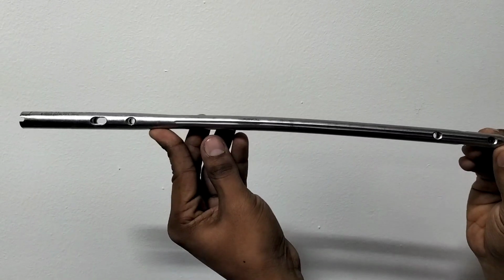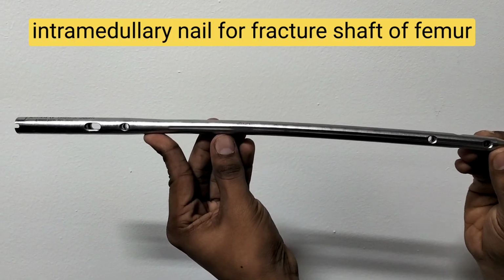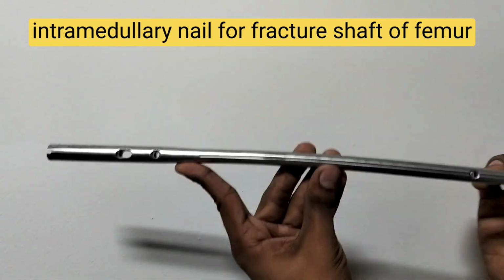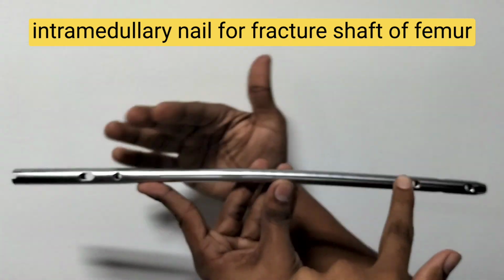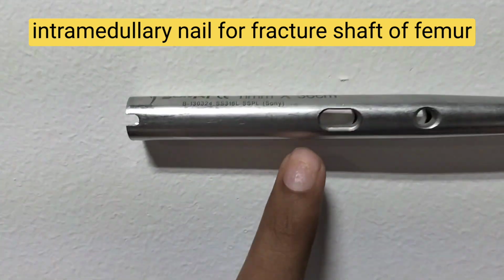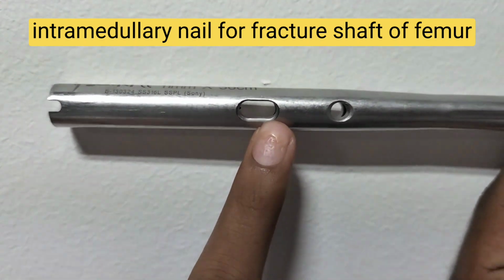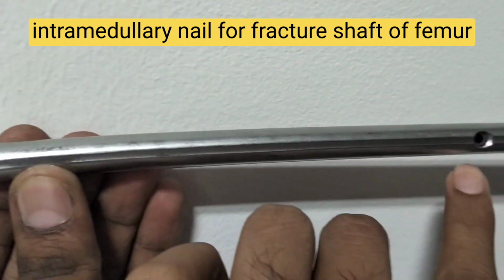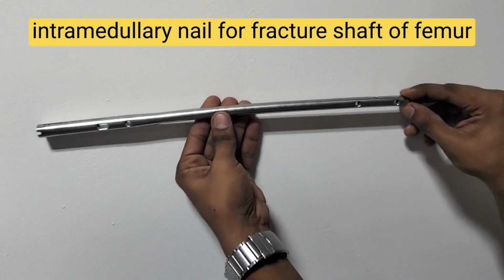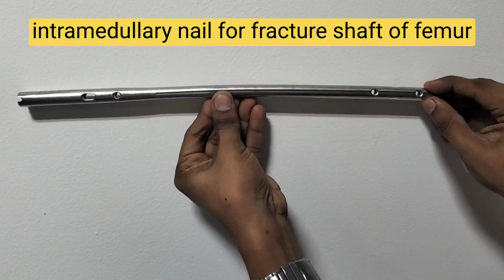Okay. Here you can see this is the intramedullary nail, which is used for fracture of the shaft of the femur. You can see there is some kind of bend here, so it is used as an intramedullary nail for shaft of femur fracture. If the holes are like this, this is dynamic. This one is static, and all below, all three are static. This is an intramedullary nail for fracture of the shaft of femur.